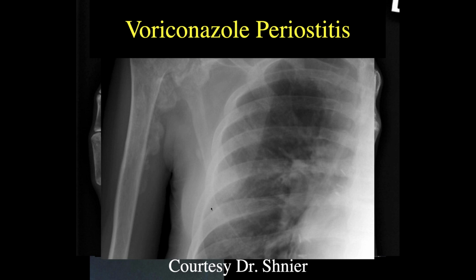This happens to be a drug reaction. Oh, okay. Hypertrophic pulmonary osteoarthropathy could look a lot like this as well, but this is a drug reaction. Does the treatment cause some of this, John? Yeah, this is a drug reaction to the treatment. Oh, yeah, okay. I'm sorry, I didn't know.